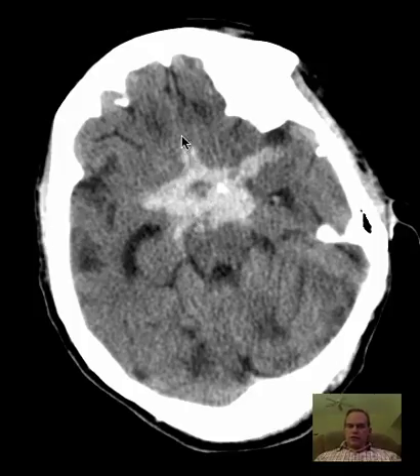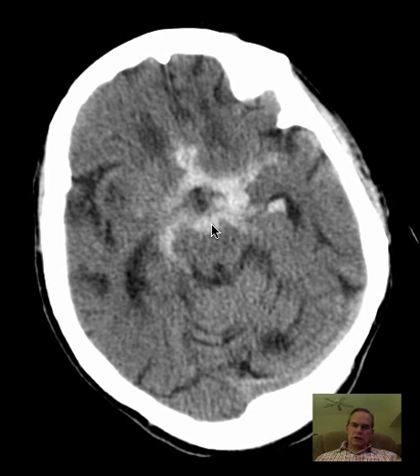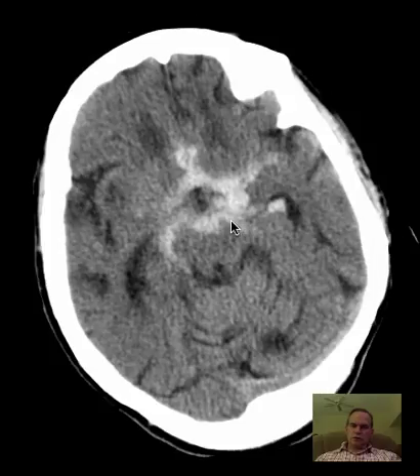So here we have little tracks here that are probably going right along the anterior cerebral arteries. Here are the middle cerebral artery cisterns going off in both directions with subarachnoid blood tracking along them. And there's some blood in the prepontine cistern, and that would be right here. Here's the pons, prepontine cistern. Then if you go up a little higher, you're in the interpeduncular cistern. That's the little V-shaped notch right here.